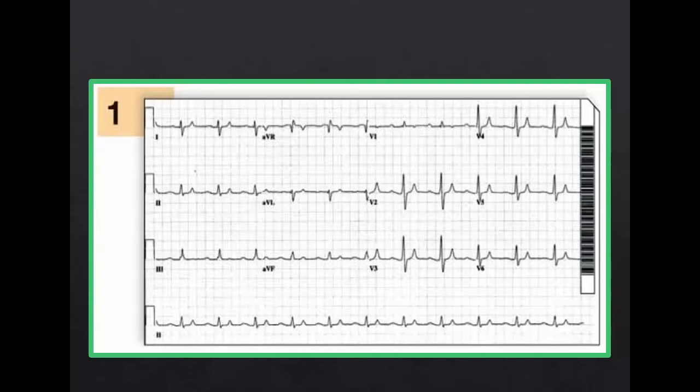The big important point I want you to take away here is that patients with chronic renal failure may not have the typical ECG changes of hyperkalemia that we are used to. So that's the take-home point there. But yes, these T waves are slightly peaked.